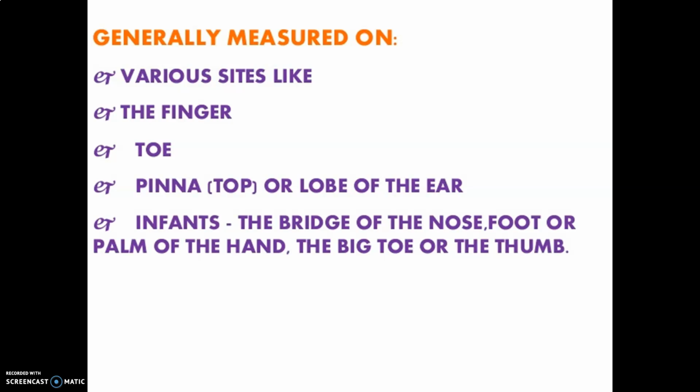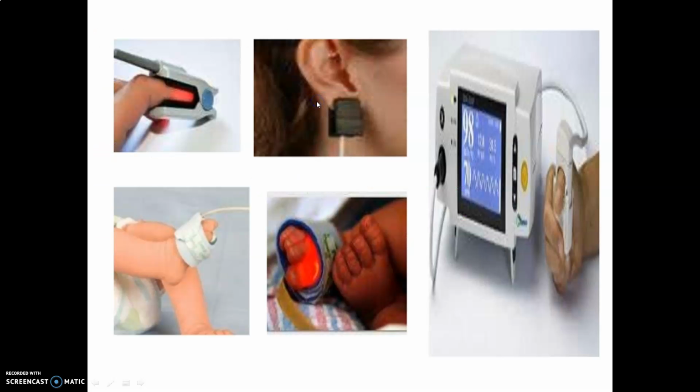So these are the basic sites of checking your pulse with the help of your pulse oximeter. Okay, I think you are understanding the topics. So these are the pictures I have collected for you for your better understanding.